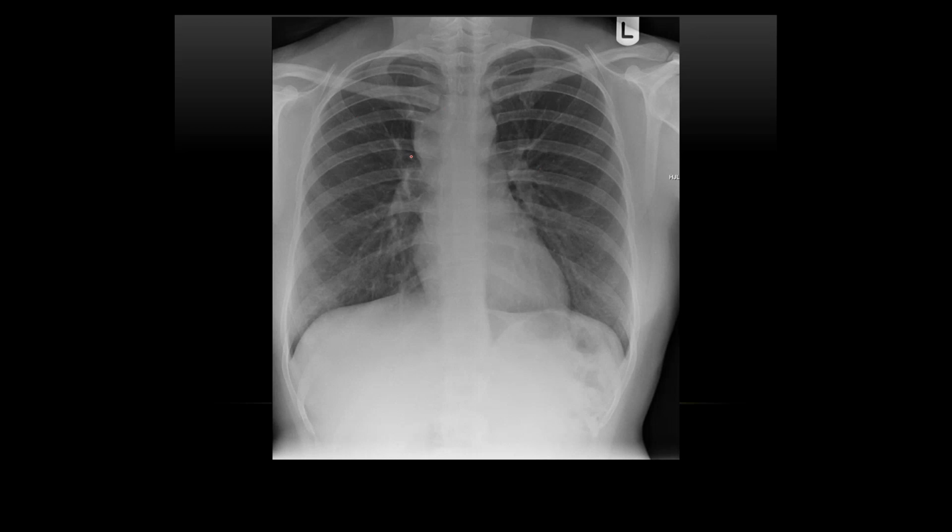Excellent. Look at this. Yeah, exactly. If you think back to what a normal chest X-ray looks like, you've usually got a nice clear paratracheal stripe. There's no bulge in this region. In this region, all you should really be seeing is SVC, azygos vein, but you've got a definite bulge in here. And this is actually a bit widened here, so this is a mediastinal mass. Yeah, excellent.